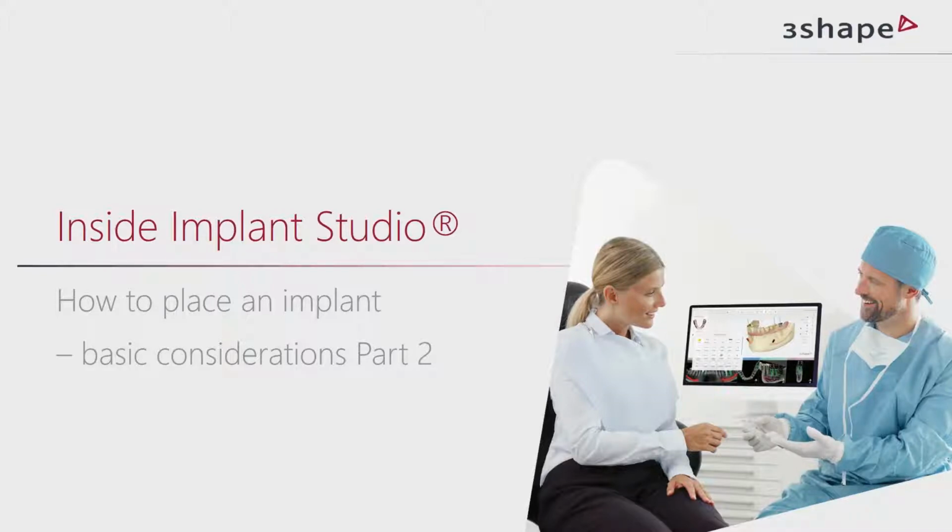Today we're going to keep talking a little bit about some basic considerations about how to place an implant. Today we're going to look further into the software side of things.